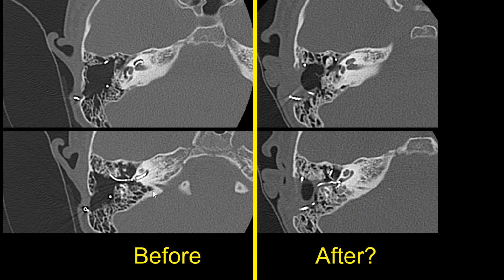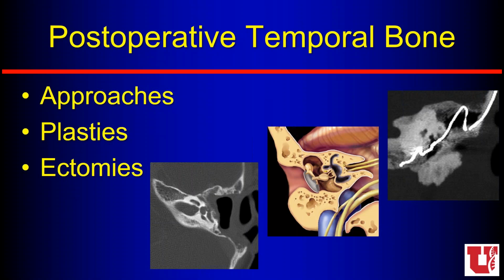So that is a review of postoperative temporal bone studies. This is a very complicated area, just like how we talk about postoperative neck studies. We have the radical and the modified radical neck dissection. And in the temporal bone, we similarly have a radical and a modified radical mastoidectomy approach. So when I see a postoperative temporal bone case, I try to think about these three things when I'm evaluating those images. I think about the approach. How did they approach the area that they were getting to? Whether it was the mastoid air cells, or the petrous apex, the internal auditory canal, or the CP angle.